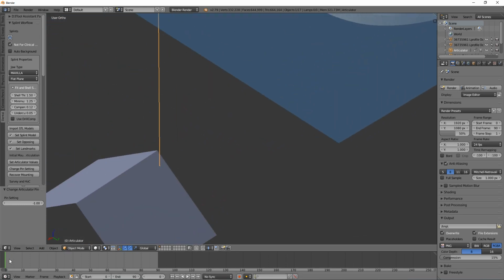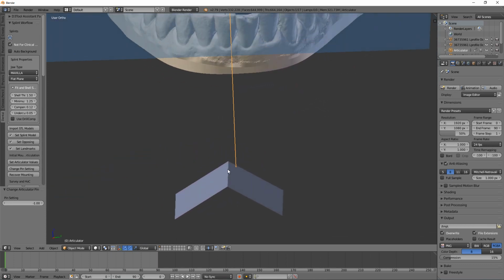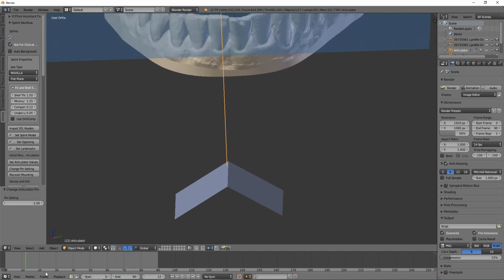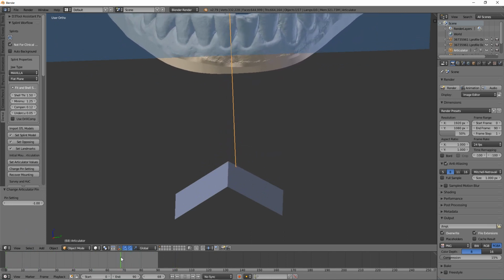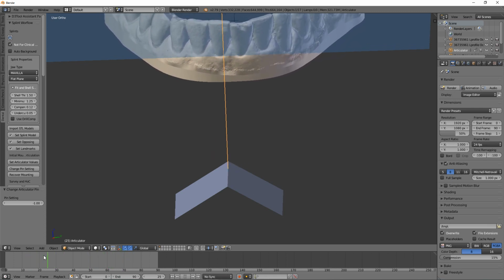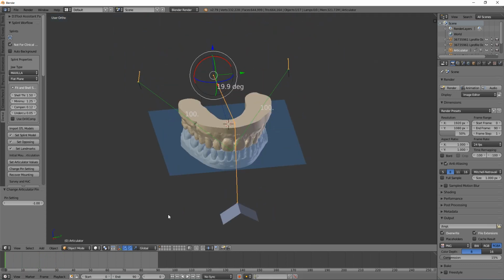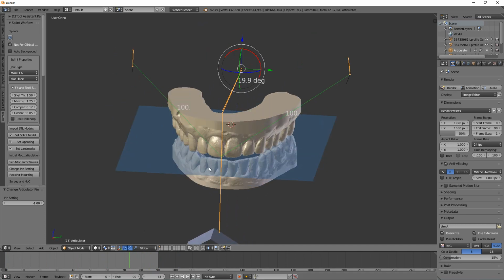And here you can see, even though we're back at the resting position, the pin is off here, partly in a lateral excursion. So the chances of that ever causing a problem are very low. It'd be kind of a strange scenario of user actions to end up there. But it always bothered me. A, the stuttering. I thought the stuttering was highly annoying. And two, there were very fringe cases where you could end up with the lower jaw in a position that just didn't make sense. Okay, enough about this. Let me pull up the new version and show you all the good stuff.